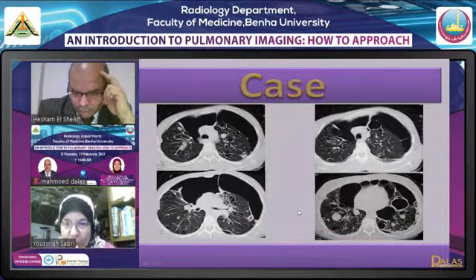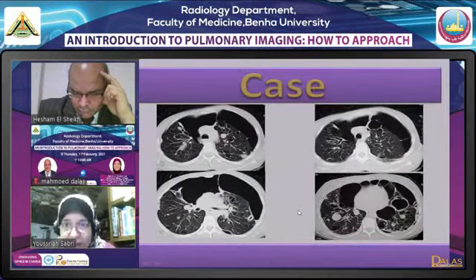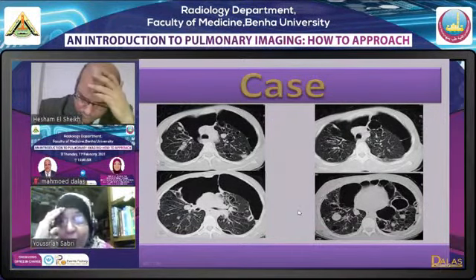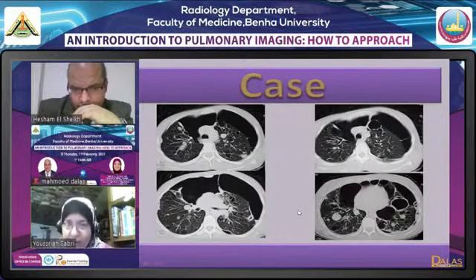بدور على distribution. لو لقيت الليجن اللي انا بتعامل معاه upper lobar predominance يبقى انا في سكه الانفيزيما. لو الليجن ديفيوز يبقى انا في سكه ان انا مش متاكده من الوول بس الليجن ده ديفيوز وابر ولور وبنفس الدنسيتي وبنفس الانتنسيتي ويبقى انا بتكلم على لام. زي ما بقول لحضراتكم عشان افرق حاجه من حاجه ما ببصش على نقطه واحده، ببص على الحدوته على بعضها. انا ده له وول، طب انا مش متاكده ان في وول، طب في ديستريبيوشن وفي جندر بريفرنس، كل ده بيتحط مع بعض.